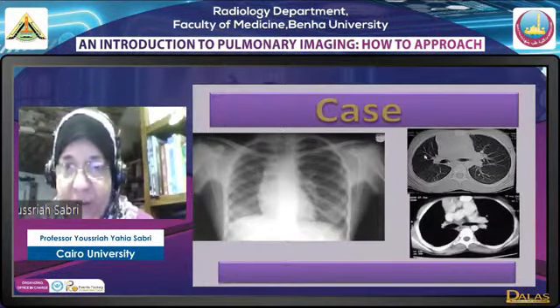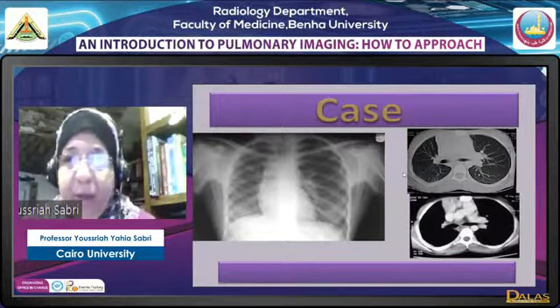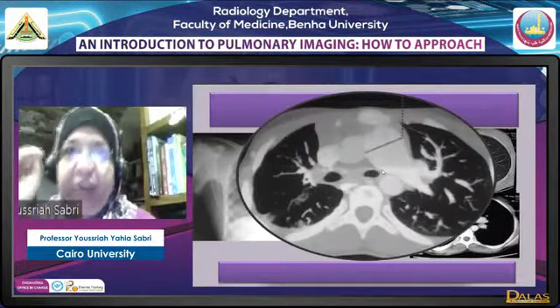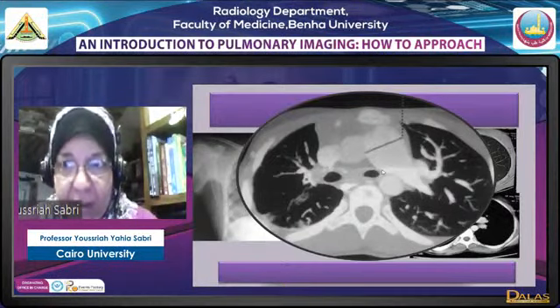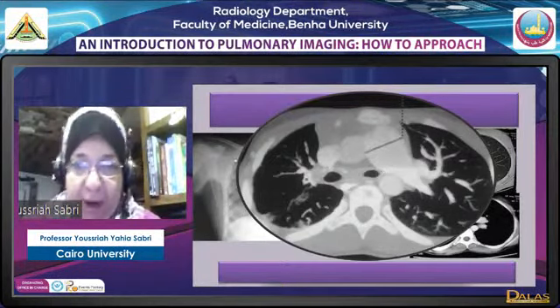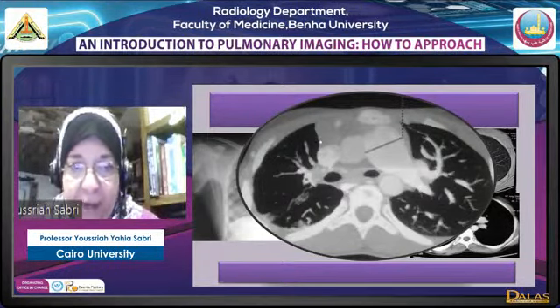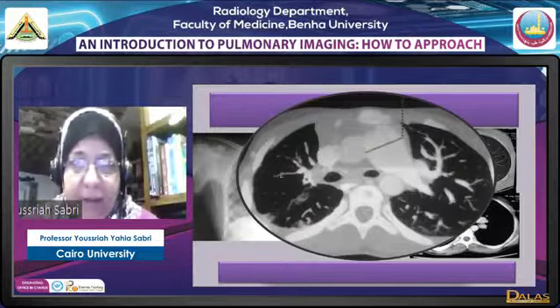Why? What has caused this small lung? There is no lobectomy, there is no lobe removal, there is no lobar collapse. What is the cause here of this congenital hypoplastic lung? It's a small black lung, born as such. We find here, this is the main pulmonary artery and this is the left, they are enlarged. There is no right pulmonary artery. The bronchial arteries are prominent. There is pulmonary circulation in the lung, but it is not coming from the pulmonary artery. They are coming from abnormal ways.